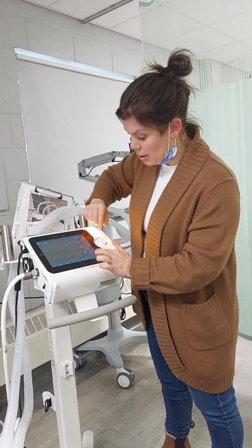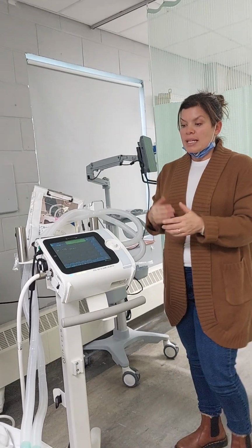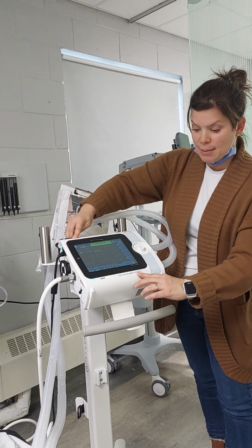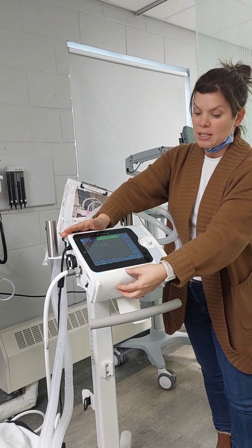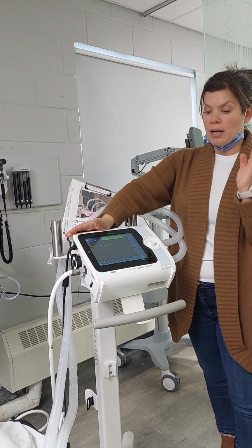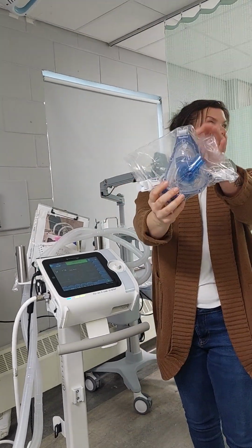Okay, I'm going to pause this. We're going to go back to the home screen. From the home screen, we set it up so you have BiPAP as a quick button. So PSV, NIV, same as BiPAP. People forget what that means: pressure support ventilation, non-invasive. So that's what BiPAP really means. You're getting inspiratory pressure and expiratory pressure with the vent. What you need for this is this kind of mask. They're right over there.